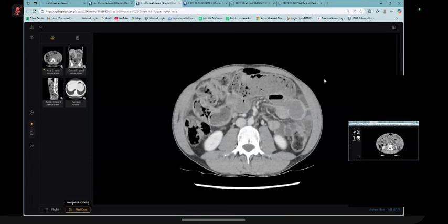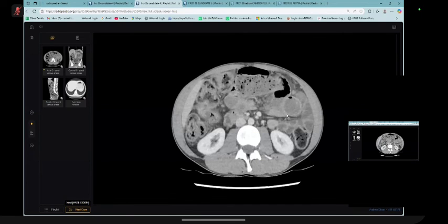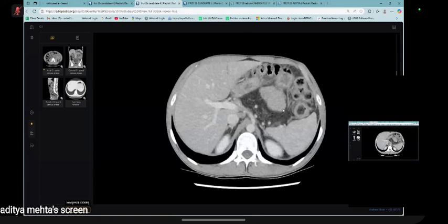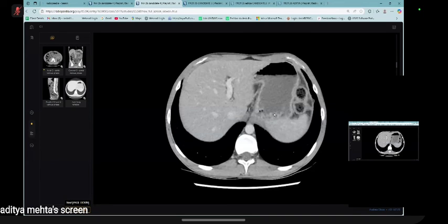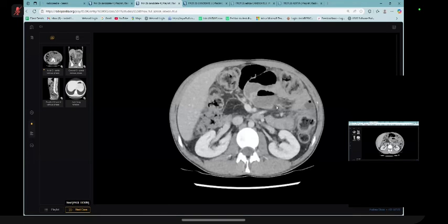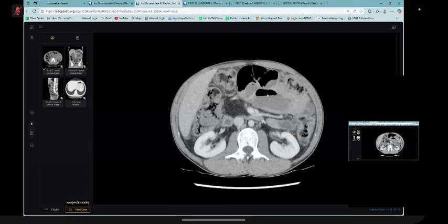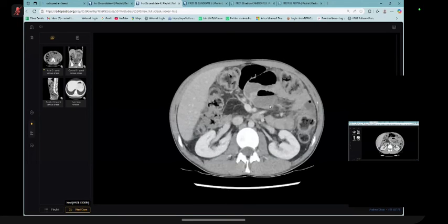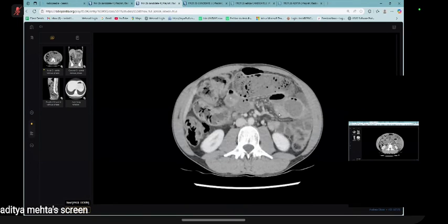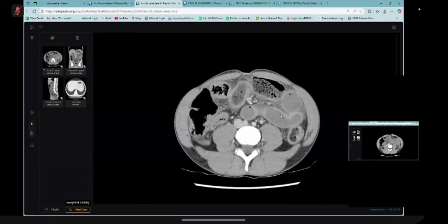18 years, sir. There is bowel wall thickening and fluid levels and dilatation that is more centered upon the jejunum. Don't approach it like that. I'm sorry, I'm just interrupting you. My clinical question is, you can't, stop it.